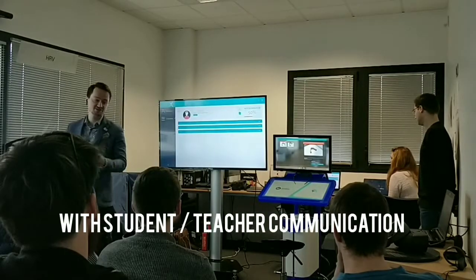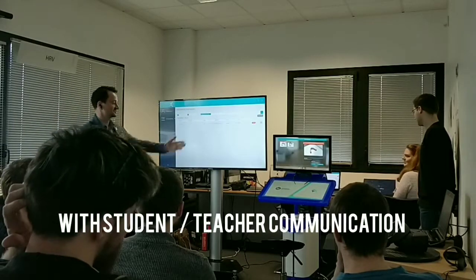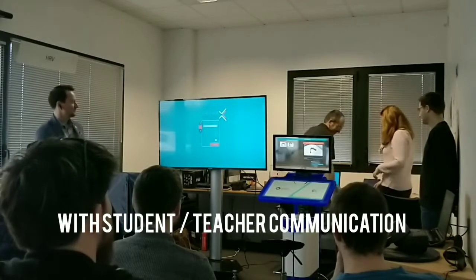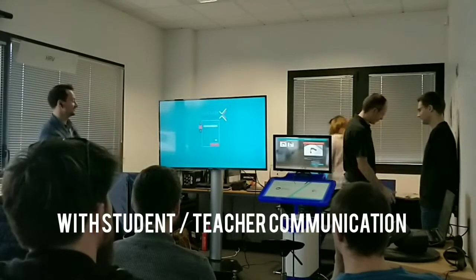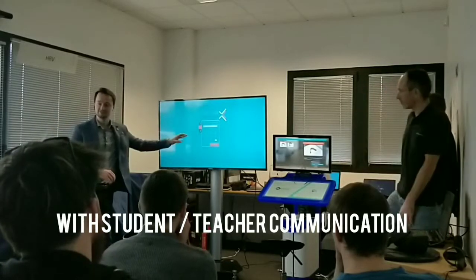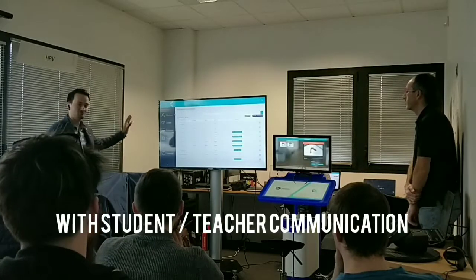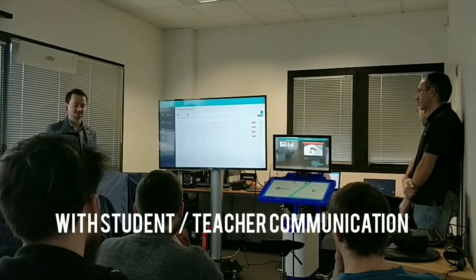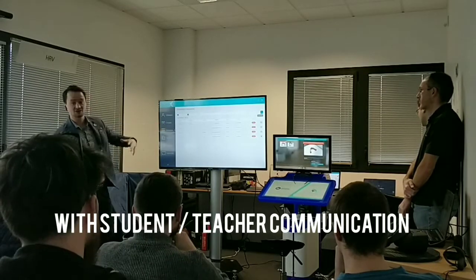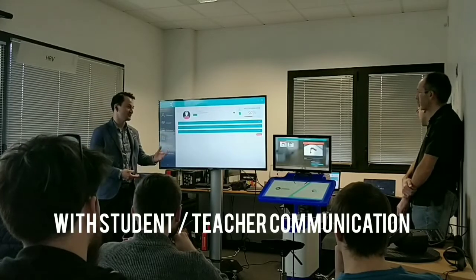So then later on in the day, our teacher, Nurse Norwen in the corner there, will come into her office and she'll log in to the PC as well, and this time with a login for teachers. So you see, we now have access to a lot more functionality within the assistant, and in the evaluations we see all of the students that are in our class. We can load up the exercise that Tony started earlier.